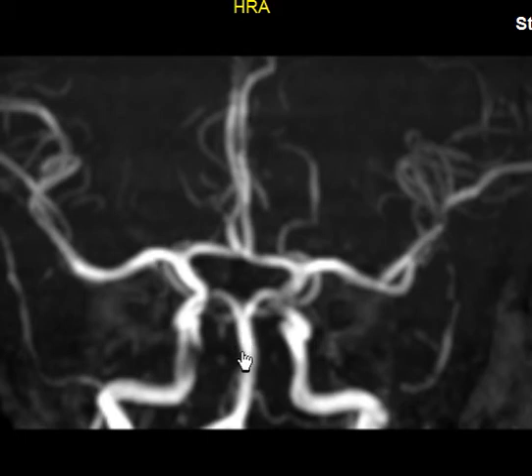Superior cerebellar artery. Okay, this is the superior cerebellar artery, and the posterior cerebral artery on the left side, and on the right side we have the superior cerebellar artery, the tiny one, and the posterior cerebral artery. Between them is an important cranial nerve, the third cranial nerve, which is the oculomotor nerve. Okay, it passes here between them. This is the anatomical position of the oculomotor nerve.